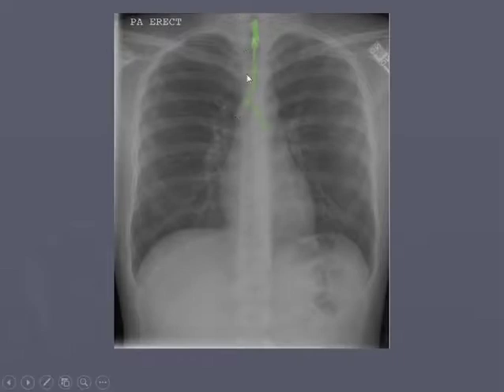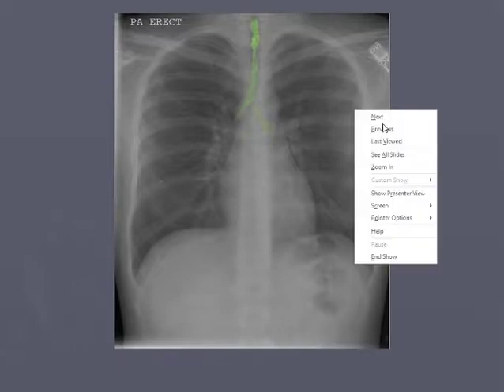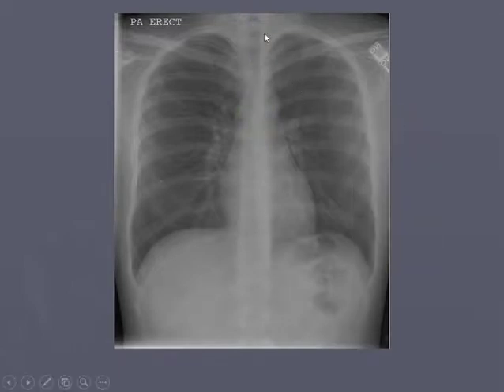This is our airway. So let me back up a little bit. So our airway, again, comes down, it's midline, and then we can see right here, there's the carina, there's the split. It should look like a narrow V shape that's upside down. And there I highlighted it for you to follow down. Again, we go back, there it is, right down there. And it should be a nice narrow V.